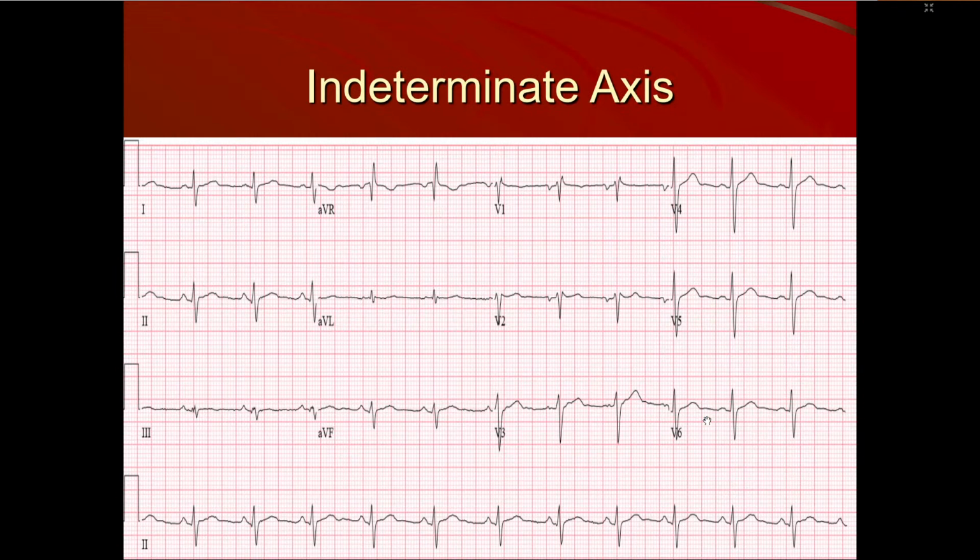So you cannot miss any findings, because you can be given any ECG and you just can't say this is anterior wall MI. There might be first degree AV block in that, and you will get marks deducted for not saying that, or early HB, or some other finding might be there, or an interventricular conduction defect. So you have to answer everything.